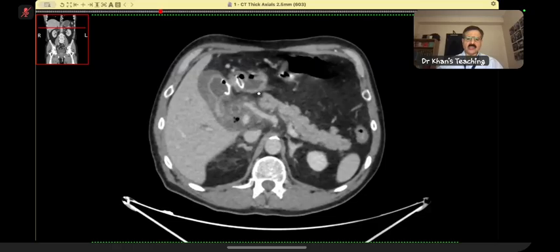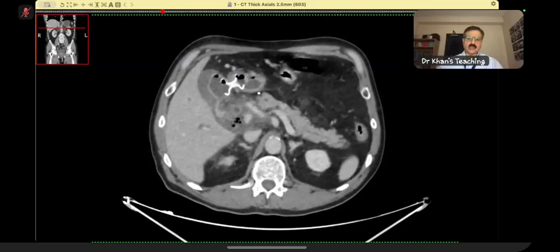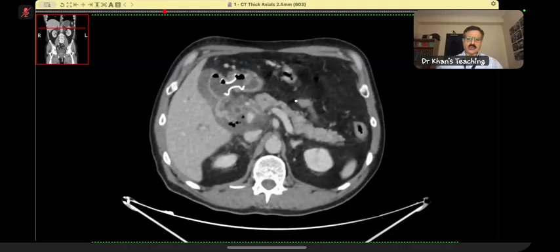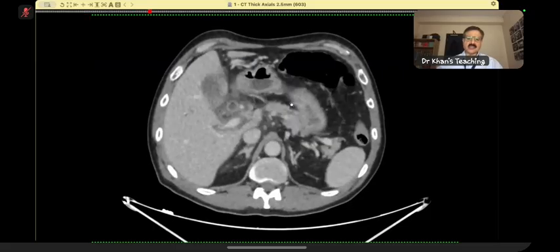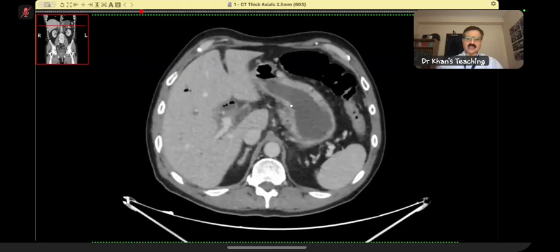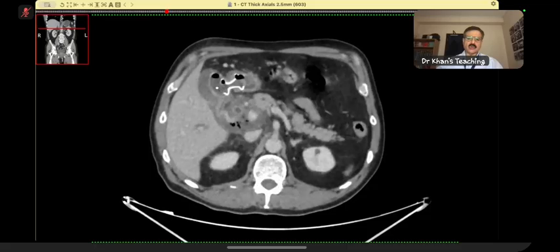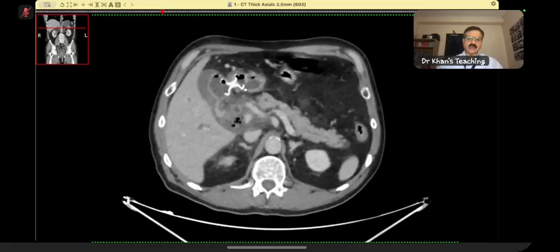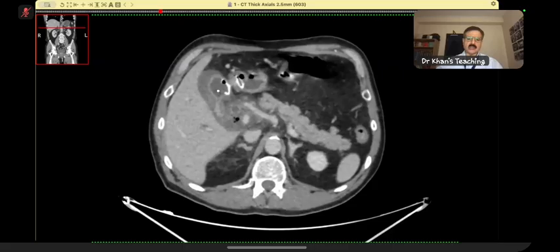Basically, they have to drain the biliary system. They can drain it into the duodenum, or into the pyloric canal. In this particular case it is self-expanding; it expands like this and like this. This case is a story case, and these kinds of cases are very important for the exam. It tells you a story. The story is that a gastroenterologist has passed this Axios stent from the pyloric canal to the gallbladder, so biliary gastric drainage or fistula. With that, you can see that there is pneumobilia. I'll come back to that aspect.